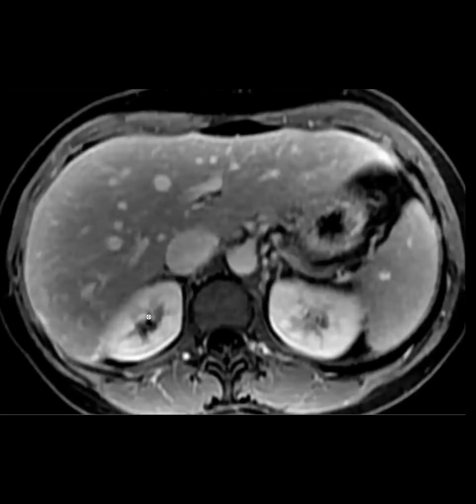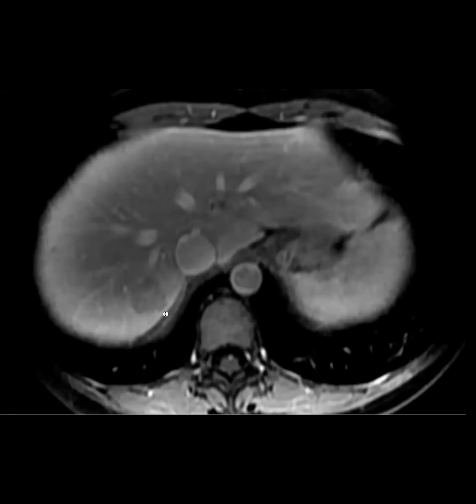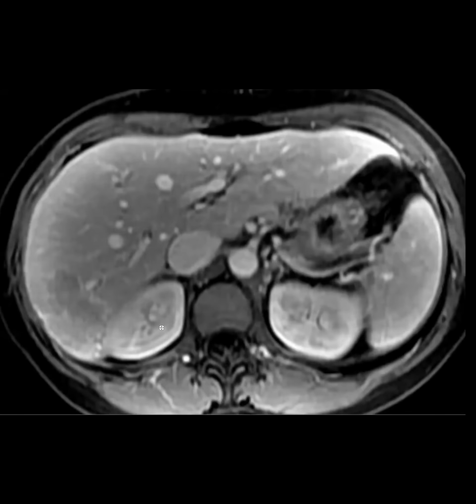Think about it. If you have a fatty liver, first of all, I don't think this patient has such a severely fatty liver. But if you have a really fatty liver, it will suppress the signal intensity of the background. You are actually less likely to have washout. If you have the curve of the liver enhancement, and now you have so much fat that it knocks out the signal from the background, it's more difficult. It can actually obscure the washout rather than exaggerate it. I've seen atypical FNHs, but with this appearance, I'd be very concerned.